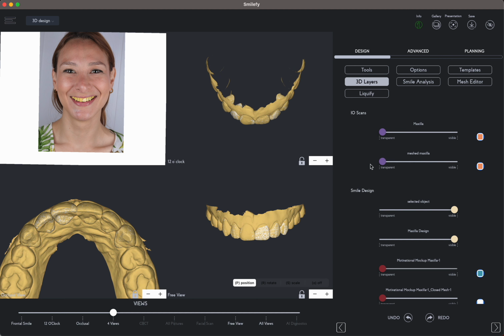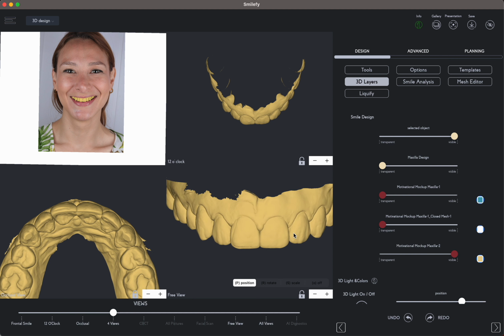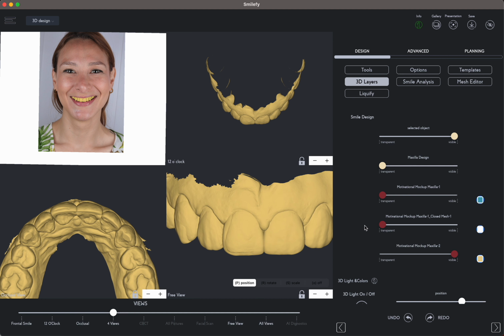The ideal pre-op design will be used to create a mockup and to use it to prep through this mockup minimal invasive. The ideal post-op is a digital visualization of the design. A quality control layer.